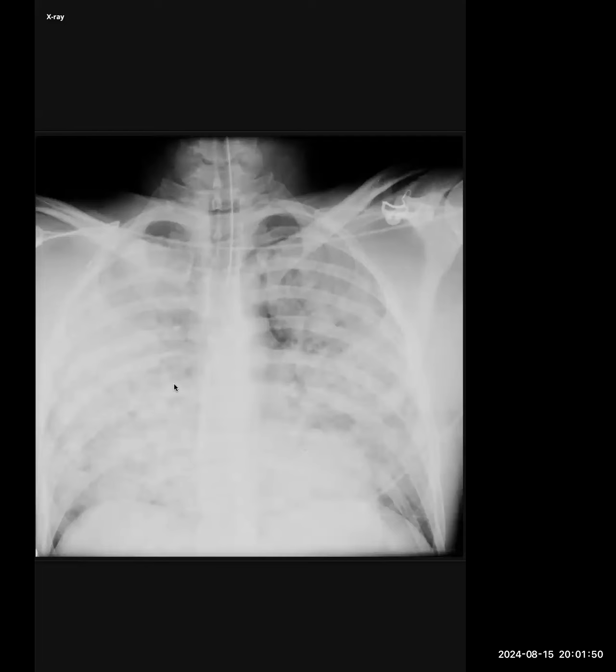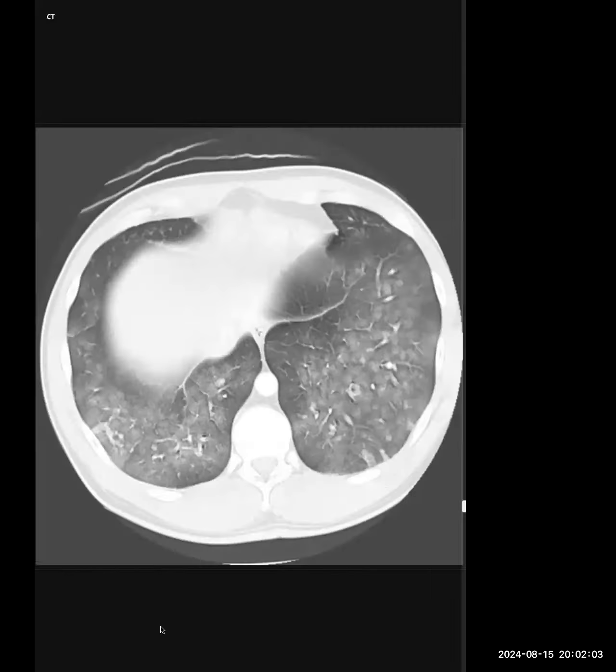Yep, this was a case of ARDS, or diffuse alveolar damage, which could be secondary to anything: infection, near drowning, neurogenic. It can be anything. But when you see this, you did describe it the way it should have been. This is also 6.5 for you.